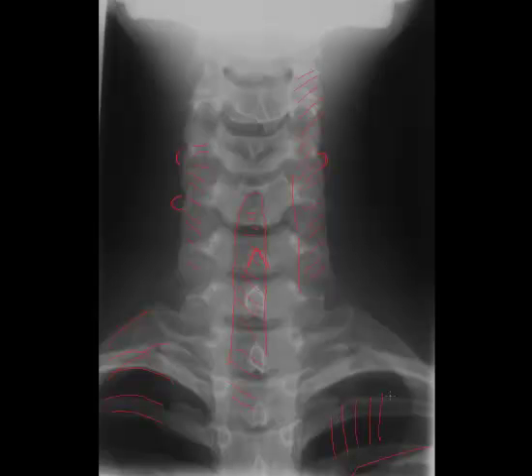There are some big, bad, nasty things that can occur in lung apices, and it's really important that we just visualize them to make sure there's no abnormalities in that location, even though this is a cervical spine projection. If you did see an abnormality, you would want to take a chest radiograph to better visualize that area.